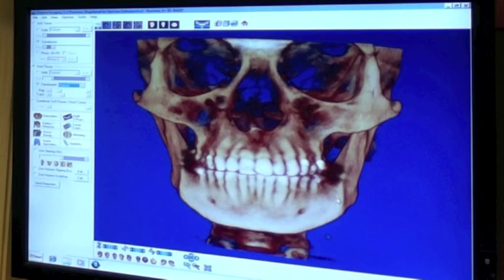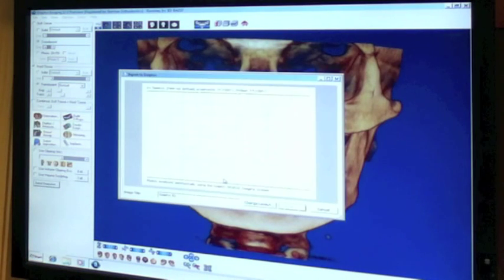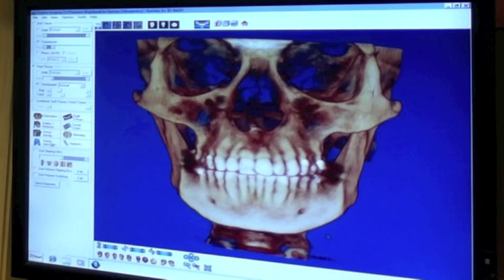So once you've oriented the image, go ahead and hit Send Snapshot and then Save to Dolphin Layout Database. You'll want to choose the sixth box down, the first of that row, already named Hard Frontal, and save. Next, you'll go down and choose Sinus Airway.